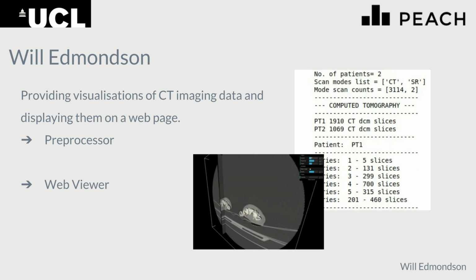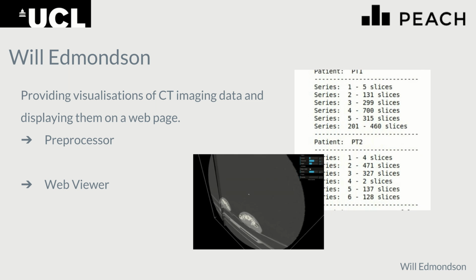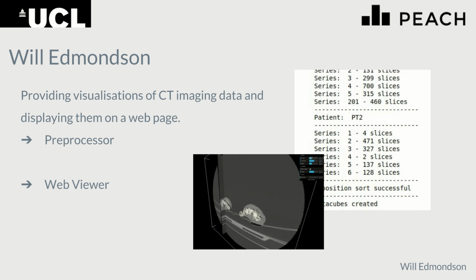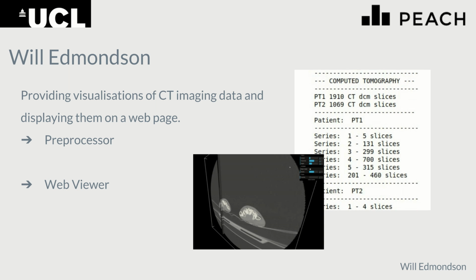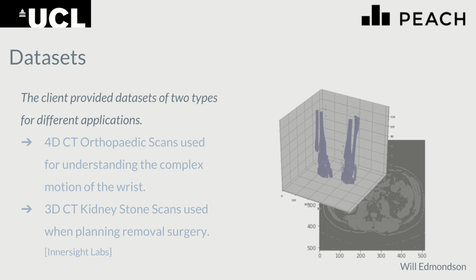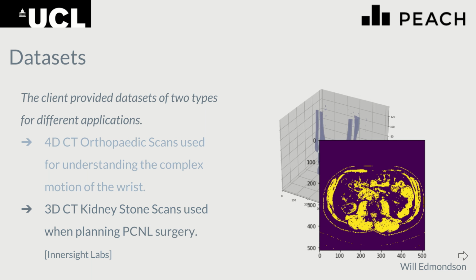Hello and welcome to Emerson's section of the project, which is providing visualizations of CT imaging data and displaying them on our webpage. The components of the application that I'll be going through are the preprocessor and the web viewer. The data sets that we were provided were a 4D orthopedic data set for understanding the complex motion of the wrist, and a 3D kidney stones data set, which meshes had already been produced for by Innersight's lab.